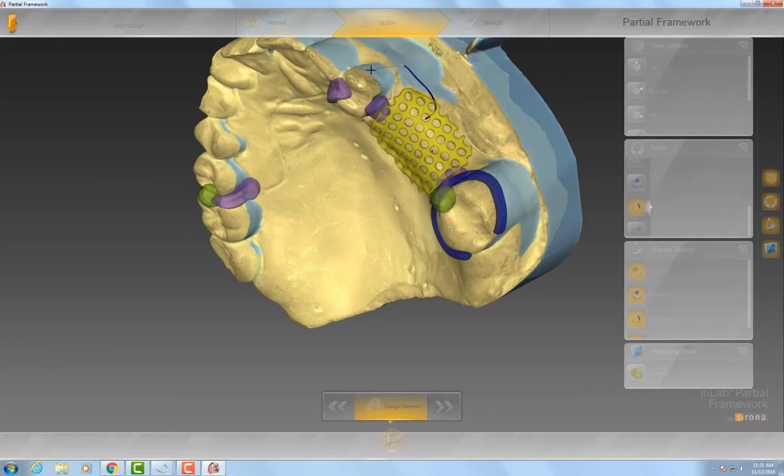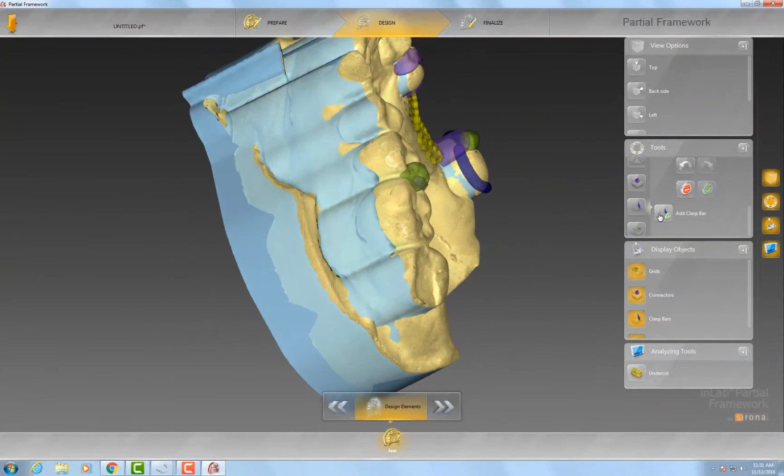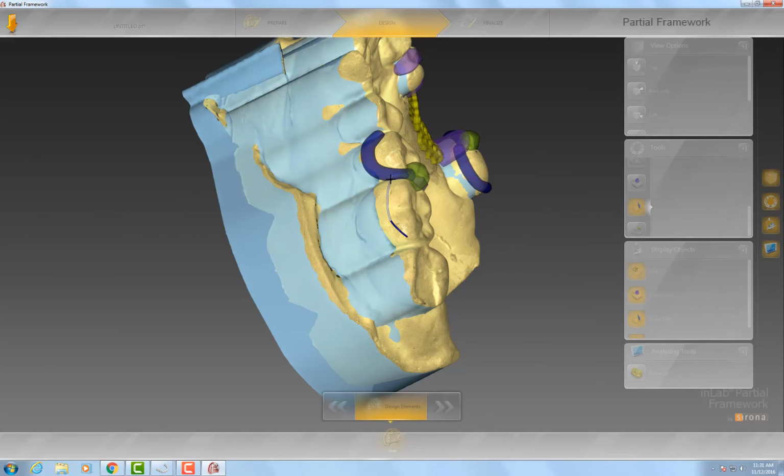And you can taper those in and taper them out, whichever one you really want to do. Now, a lot of the times, like I was saying before, the designs on mine will be a little bit flawed. But it is supposed to show you just really the purpose of why we adopted this software.